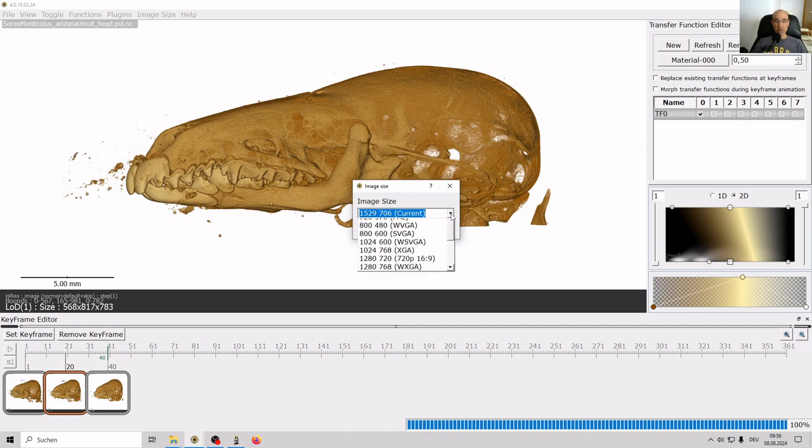And that might work, but I think probably a better bet for typical YouTube visibility with the kind of equipment that most people have these days, you'd probably want a 16:9 ratio. That's going to be on the low end, but still perfectly visible. So I'm going to pick 1280x720. That's going to be the image size it's going to export these images to. And it depends. If your image is really up close to the edge of one of these axes, then you might cut something off.